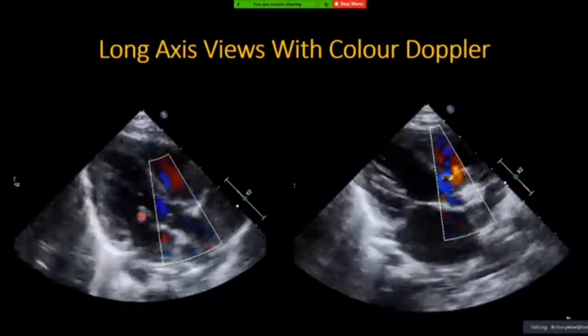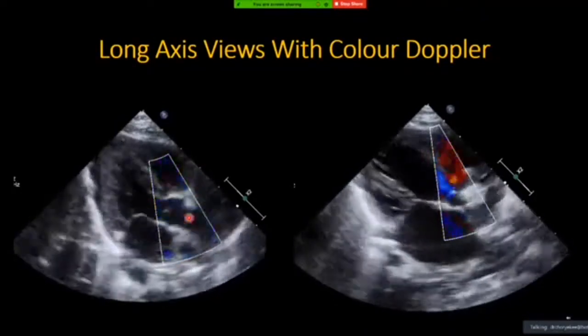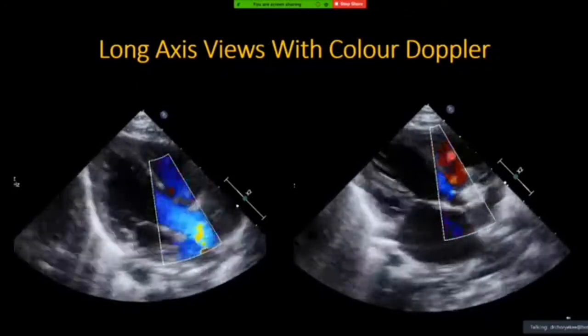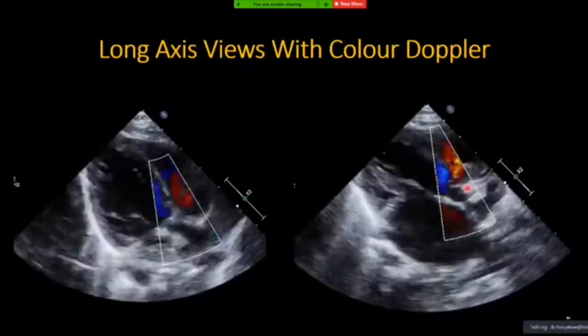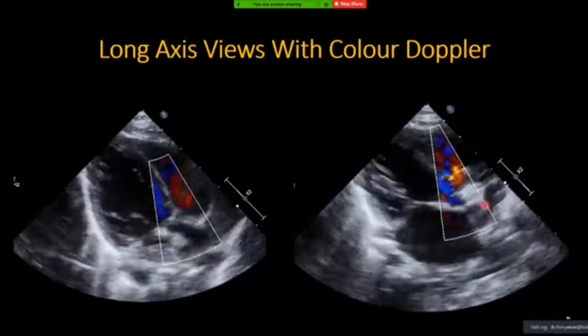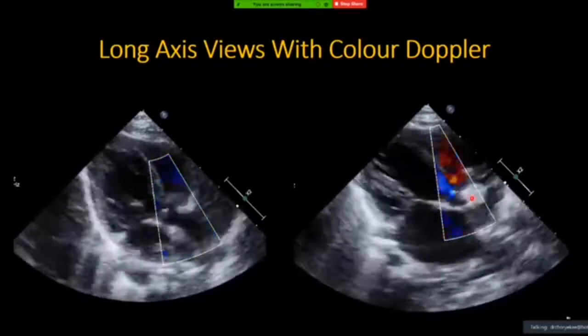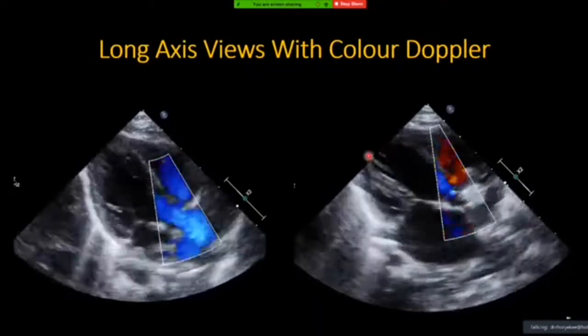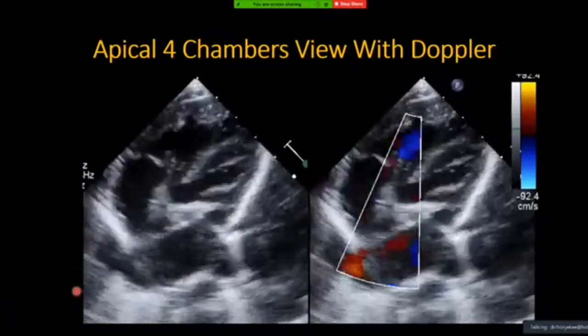this is the normal Doppler that you see. When you see some abnormal jet flow through the hole, you know there's some abnormality here. So with that, you know that this child has a significant VSD, and the VSD has caused significant failure with a really large and dilated left heart. So this is a color Doppler.